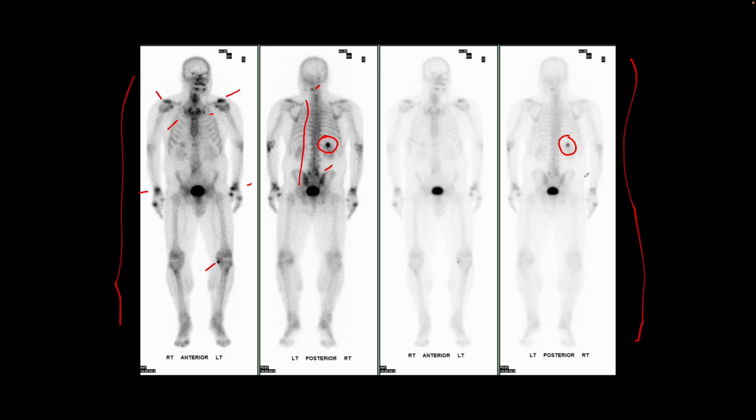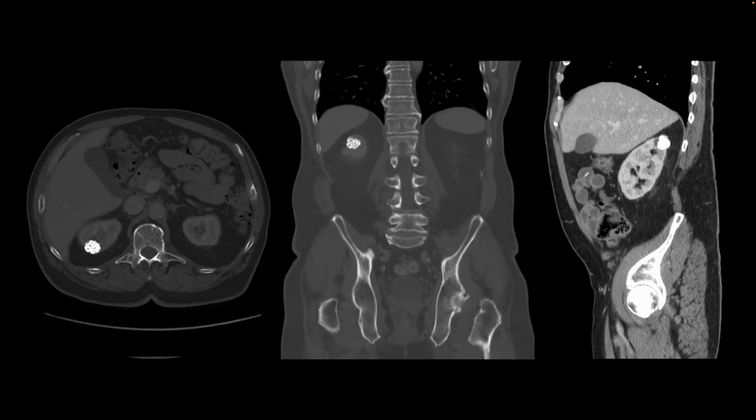So incidentally, this patient got a CT scan of the abdomen and pelvis, and interestingly enough, we found several stones in a cystic focus sitting right there in the right kidney, seen here on the coronal image at the superior pole. I have windowed it so that you're able to see these multiple hyperdense stones clearly, compared to soft tissue windows here where we see the cystic focus, some non-dependent fluid, and all of these dependent stones.